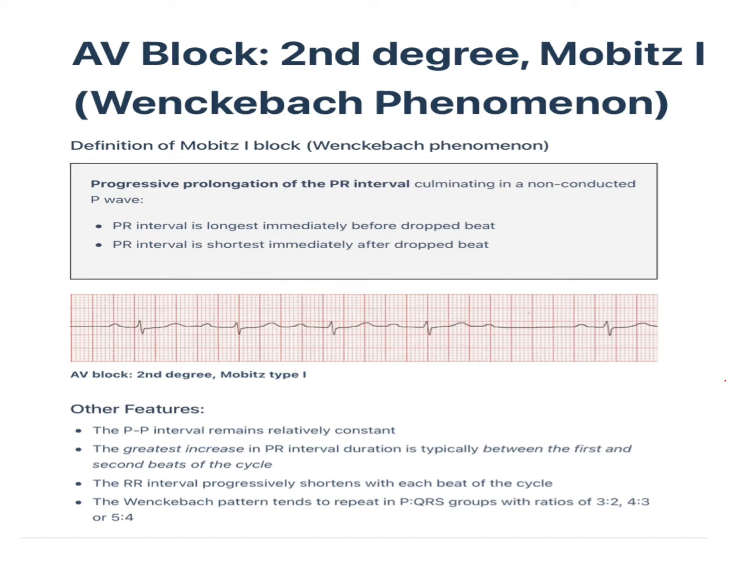Again, some other features need to be noted. This is the PP interval. The PP interval usually remains constant. But the RR interval, this is the RR interval, progressively shortens.